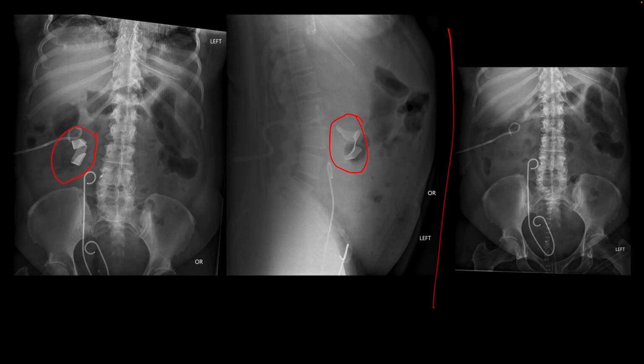They also have ureteric catheters and a percutaneous nephrostomy catheter, and the plain film on the right shows after surgery when the lap sponge was removed. So this is the characteristic appearance of a lap sponge on plain films, not to be missed on a post-op film from the OR to look for retained foreign bodies.